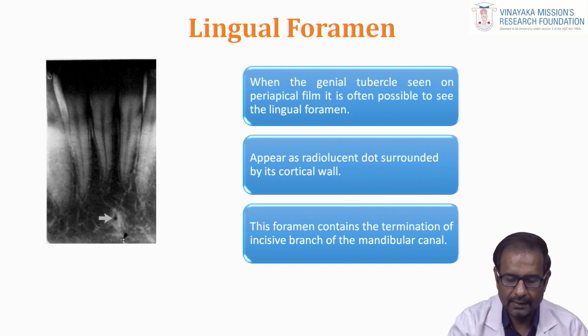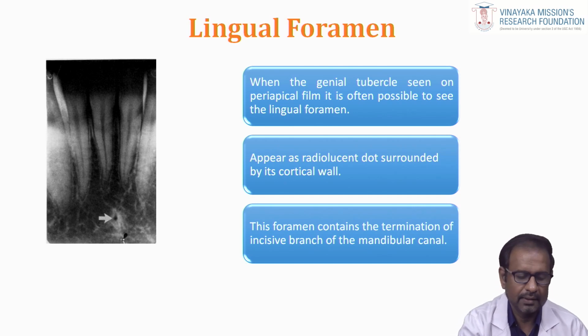The foramen contains the termination of the incisive branch of the mandibular canal, the termination of the mandibular nerves and vessels. Here it emerges. So the lingual foramen is a small radiolucent area.